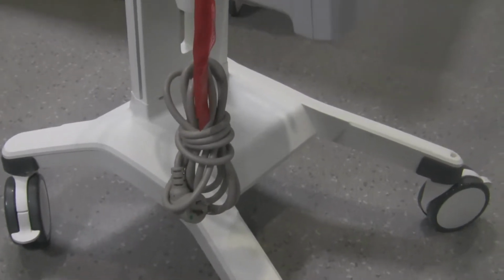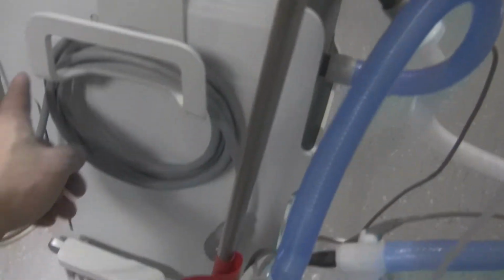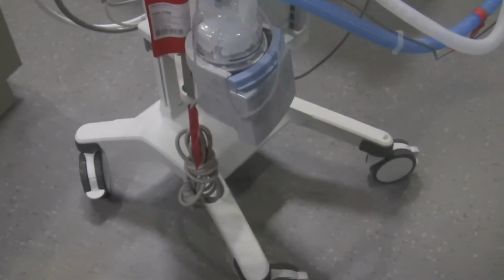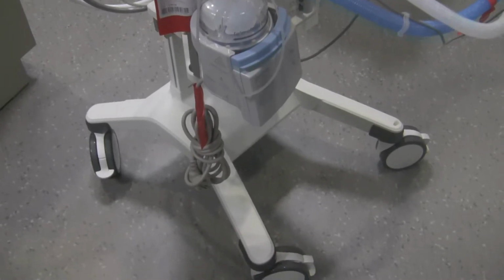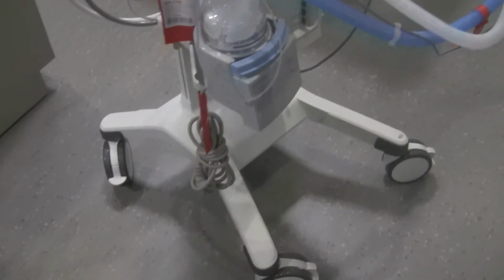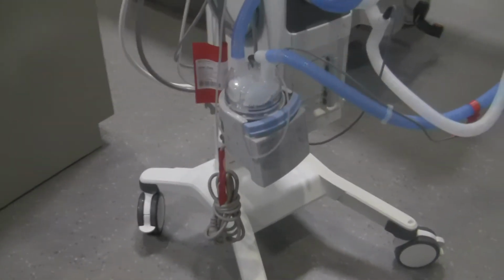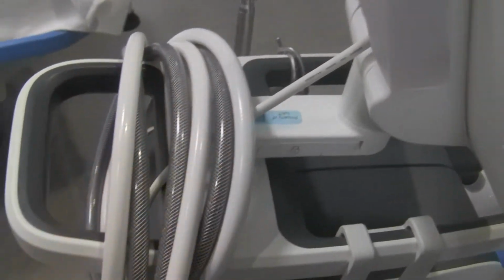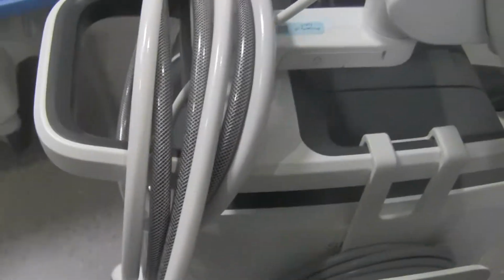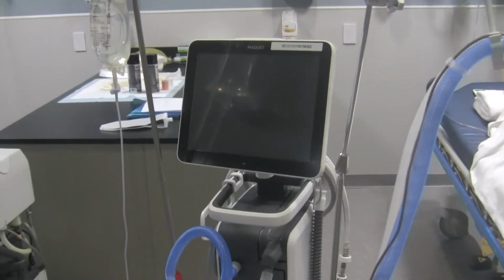So when you're plugging the ventilator in to get the power into the unit, you have to plug in the main cord for power. But if you're using the humidifier, and you should be using the humidifier if you've got one, you have to plug in the humidifier cord as well for it to work. So it's a two-step plug-in: plug in the ventilator, plug in the humidifier. And last but not least, make sure you've got your gas hoses connected to the appropriate station outlets so the ventilator can function. Once you've got all that in, all you simply have to do is turn your ventilator on.